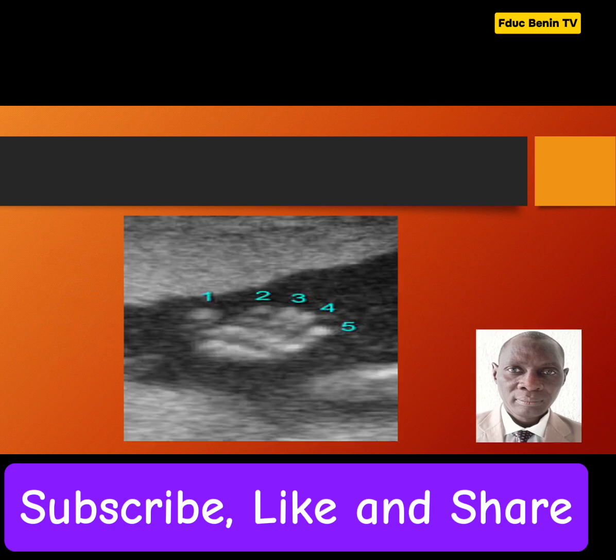Now, this is an image that clearly depicts the appearance of a normal hand. You can see the 5 fingers, including the thumb, which is clearly demonstrable here.